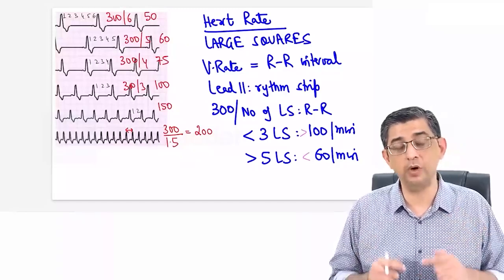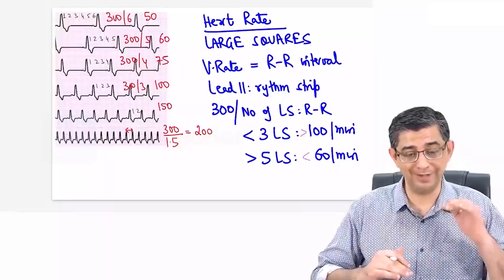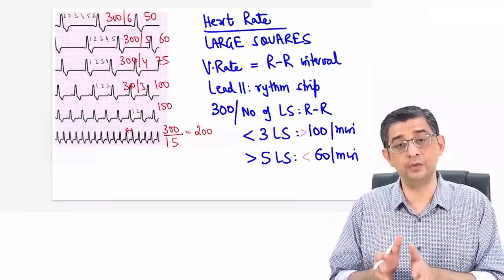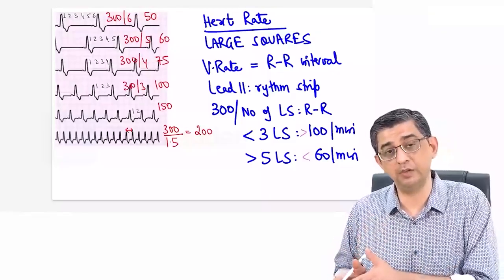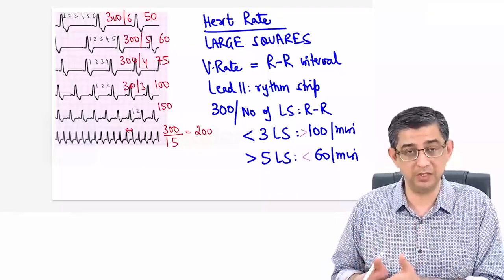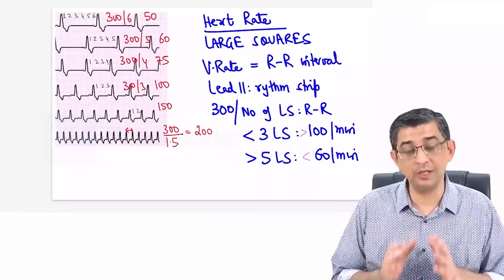So now I'm going to teach you how to evaluate the axis. We'll go stepwise, 5 seconds for each step. It's heart rate, then axis. Then we look at the P wave, we look at the height and the duration. Then subsequently, whether the P wave is followed by a QRS complex. Is there a normal sinus rhythm? Is there a drop beat present in the patient? So that comes with practice. But the first 10-second roadmap is mainly clear before you.